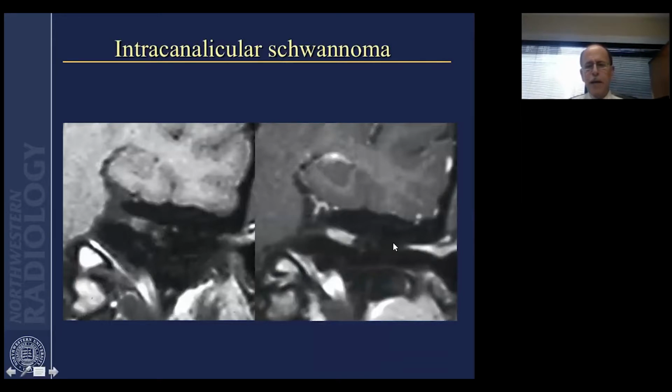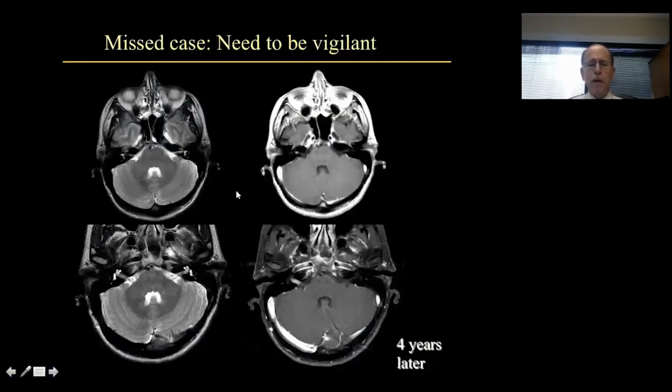This is an intracanalicular tumor. So there's no cisternal component on pre and post contrast MR. This is a case of small vestibular schwannoma that was only detected in retrospect on a follow-up scan because the initial study was done for a completely different reason.